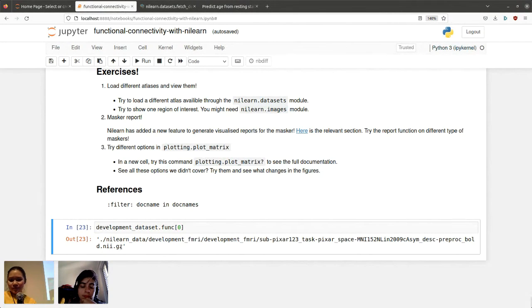So when we are loading the data from Nilearn, usually from those dataset modules, the .func usually refers to functional data, and those images are too big to be loaded as a direct signal, like with some kind of binary format. So we are using a path directing to the file stored on disk.